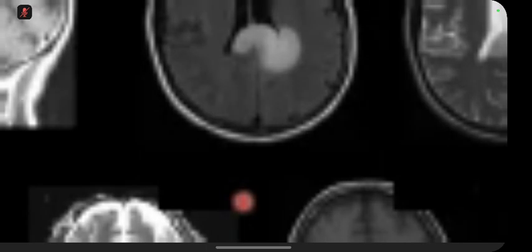Okay, so what is your differential? Differential for this that's crossing the midline would be a high-grade glioblastoma could present like this. 27-year-old, anything else in the differential in the tumor world? Can enhance, and they should be in the differential. Okay, cool. A younger patient, maybe before the GBM.